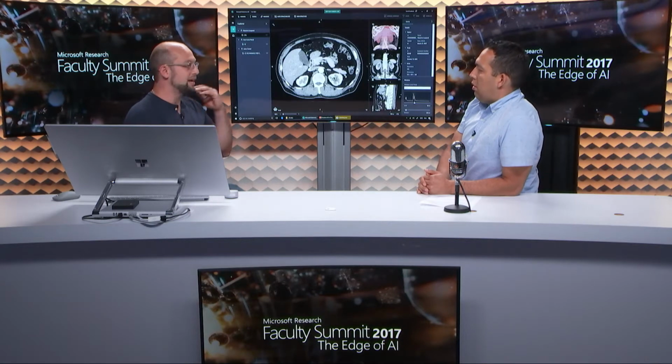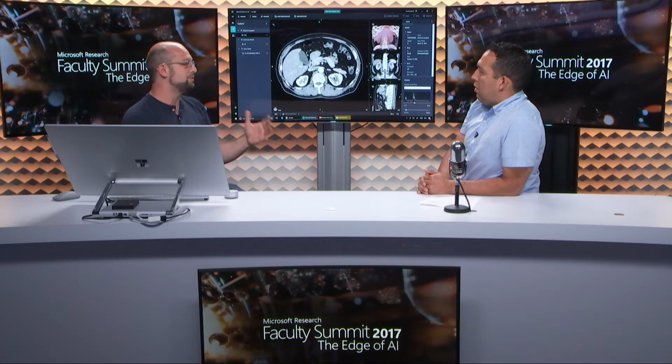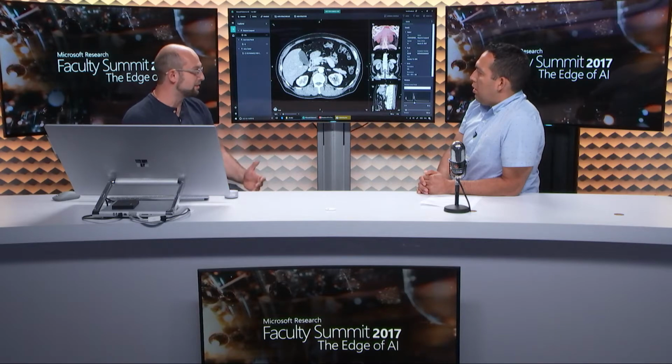Yeah. So what does InnerEye actually do to help that, and how does AI help? So our team, there is a team of researchers in our MSR Cambridge UK lab who worked on computer vision and image segmentation problems for many years. They contributed to Microsoft Kinect, and right now we are using the same principles to build machine learning models that can actually find those body parts for you in an image.